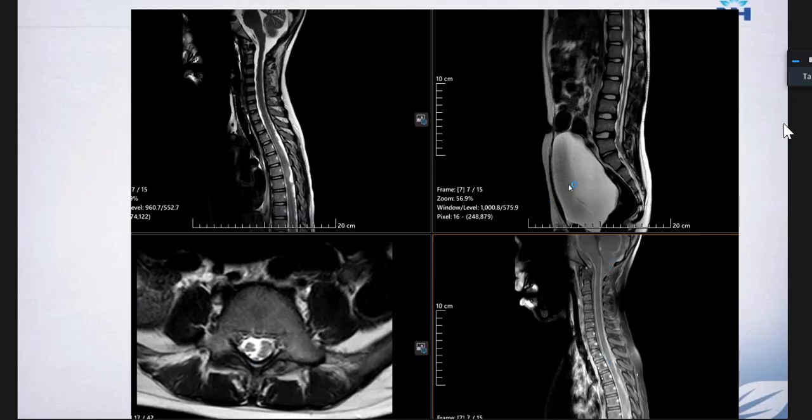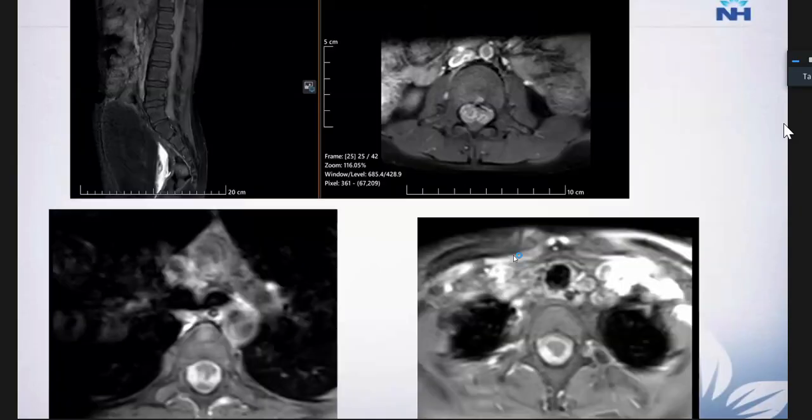And these are the T2 weighted images at the lumbar region, which also show nodular thickening and clumping of the cauda equina roots. So more and more we were in favor of a neoplastic etiology. It could be diffuse metastasis, or we also thought of a high-grade variety of leptomeningeal glioneuronal tumor, as it had progressed within 1 month from some mild meningitis to a very frank, aggressive-looking leptomeningeal spread of the disease.